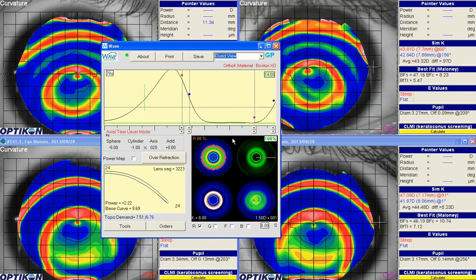And then to align the periphery, I usually put the pink dot at the HVID, which is 11. And then we're going to bump the control point up here until it's right above the 20 micron line. So we're not bearing down on the limbus of the cornea.